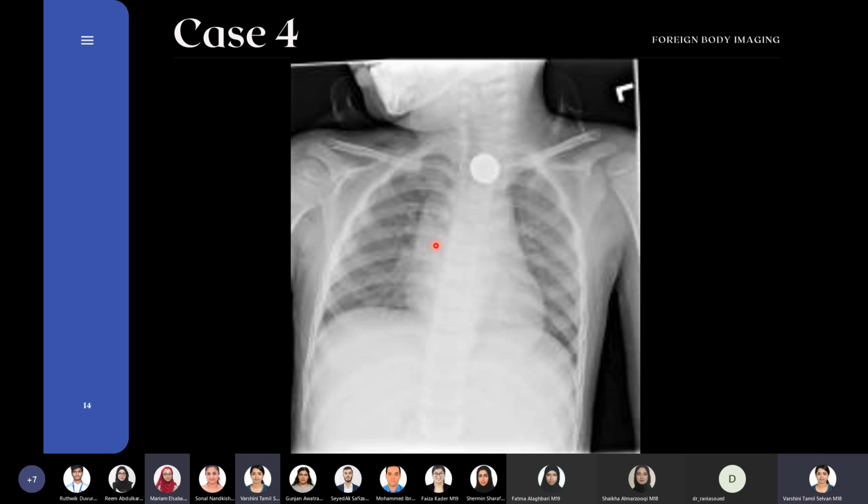No, I don't remember actually. Oh, okay. No, I'm not sure. Actually, you don't have to worry about it because I will be covering that bit as well. You can see it in the frontal view as well, but there is a slight difference between them. But let's move forward with this case for now.